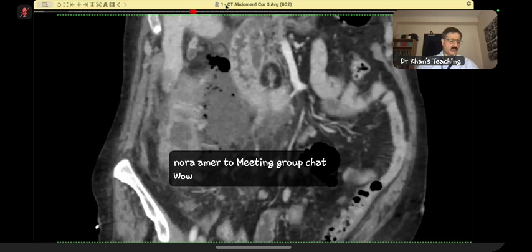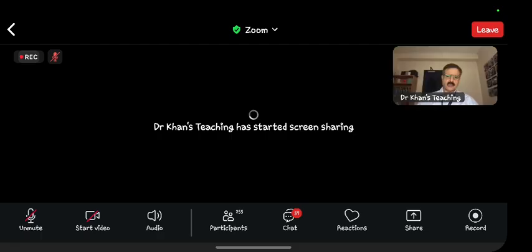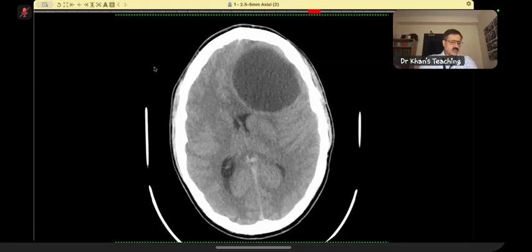Okay. So next, second last case, easy case. Over to you. This case is an 18-year-old in A&E, disoriented, fever. The patient came disoriented and with fever.